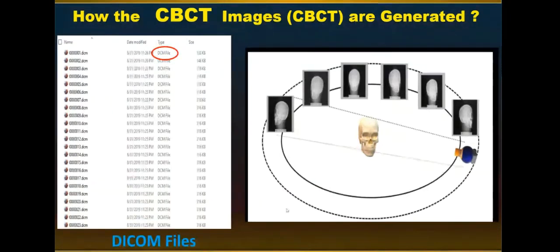So what's important about this? When you are using an implant planning software, you must import these DICOM files to the computer in order to be able to read the case and start working on it.